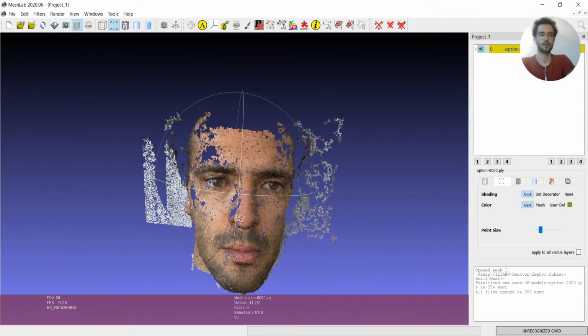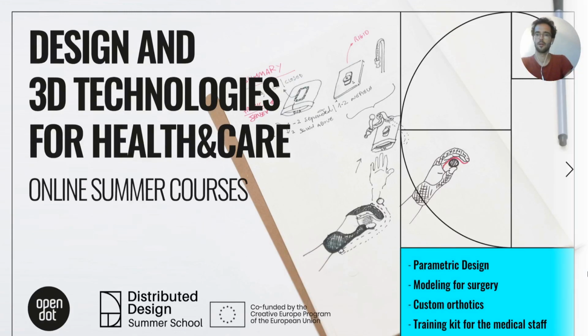Okay, I think we are done, and we'll follow with a very quick lesson on Meshlab. So stay tuned for the next tutorial.